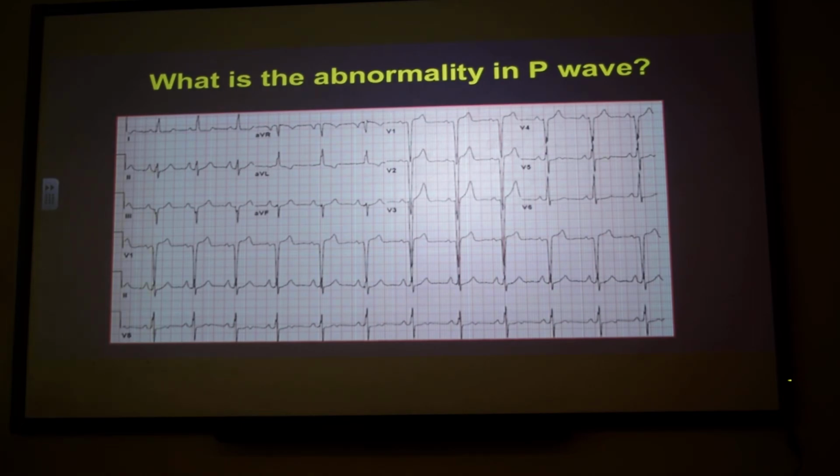Look to this ECG. Again, I'll give you an initial part. This is normal sinus rhythm, rate is fine, regular. But now we are concentrating on the P wave. Is P wave morphology here normal or abnormal? Abnormal. So it is more peaked than normal. So what do you think for this one? This is right. That is very large. So the normal P wave height, we said it's 2.5 or less.